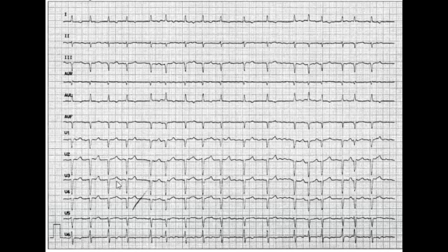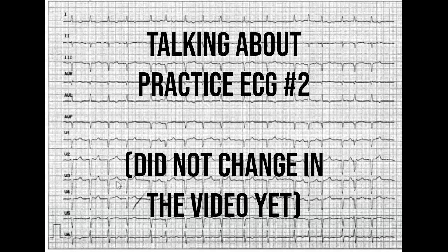For anyone that wants to solve this ECG, it's ECG number 29. Okay, so again, we will start the 10 steps quickly.